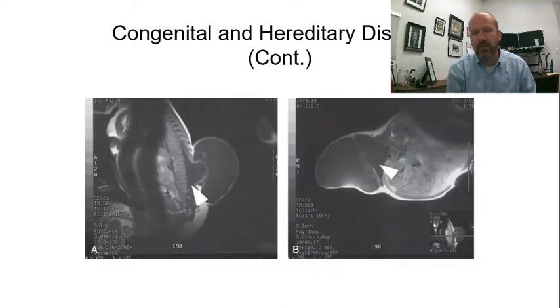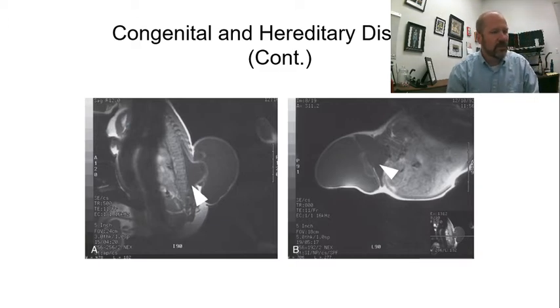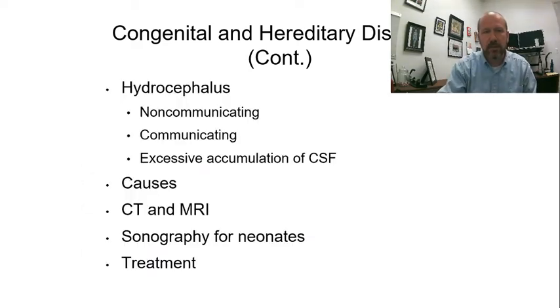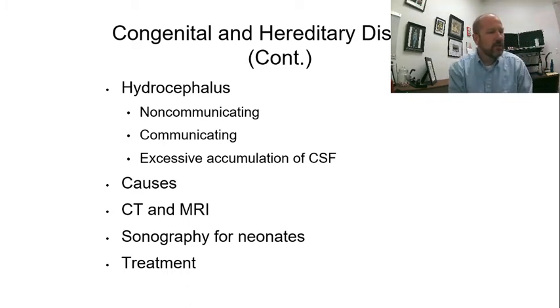Here's an example of a sagittal MRI image showing, I believe, a meningeomyelocele. Yes, meningeomyelocele, and we've also got some gadolinium contrast on board, so we can actually see where exactly the spinal cord is. Hydrocephalus, we can have both communicating and non-communicating forms.